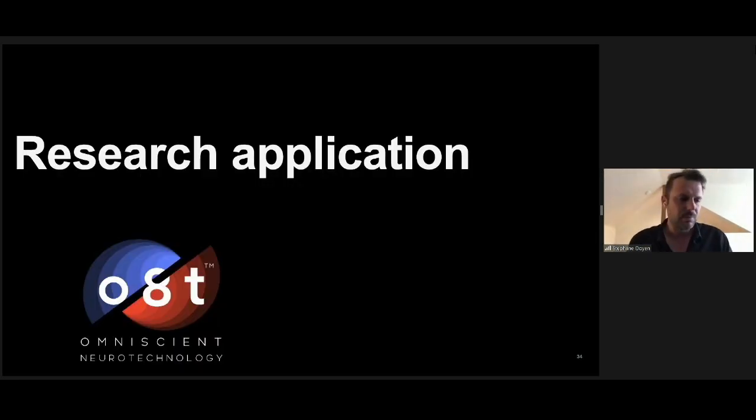Okay, so moving on to specific applications. Michael will cover some more clinical applications, but before we get there, I wanted to take you through some of the potential research applications you could get to using the software. We really thought about the software and how we made it to empower researchers with great tools. Michael walked you through the viewer, which is extremely nice for looking at patients' parcellations or subjects' parcellation scheme and different tractography elements. But a lot of the research actually starts at that step, meaning this is the point in time where you have data in a usable format that you can start to interface with what you're trying to get to.